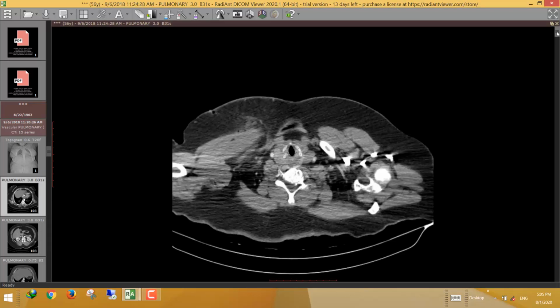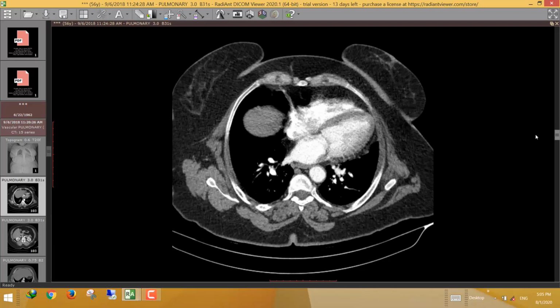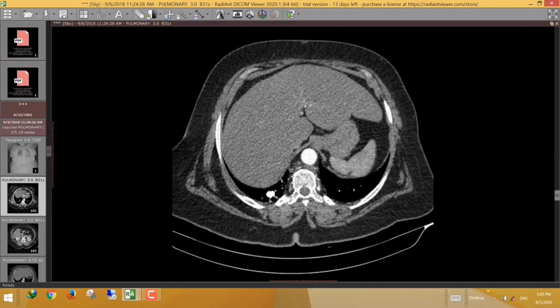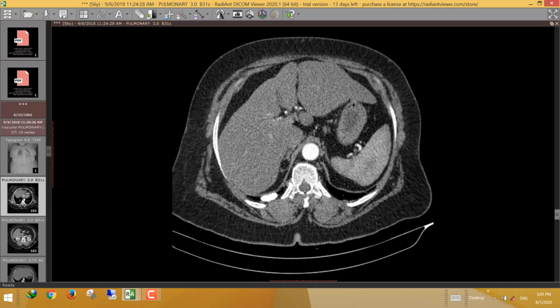And in the pulmonary AVM, it is usually a fistula, it is not a true AVM. It is usually a fistulous communication between the pulmonary artery and pulmonary vein, inducing the pulmonary nodule. In the pulmonary angio post contrast, we can see the intense enhancement of the pulmonary nodule, which represents the site of the fistulous communication between the pulmonary artery and pulmonary vein.